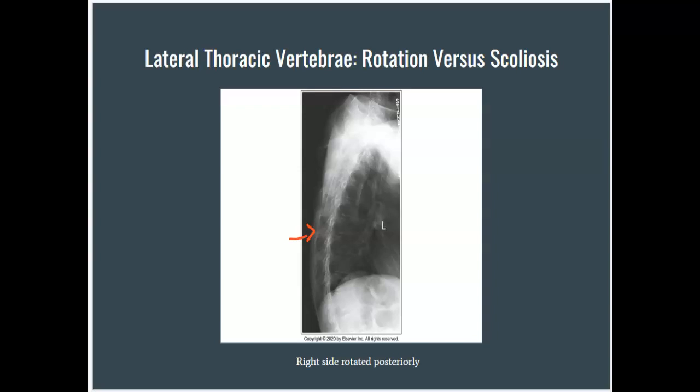If the elevated side is rotated posteriorly, the posterior ribs demonstrate more than 1 inch of space between them. If the elevated side was rotated anteriorly, the posterior ribs are superimposed on a slight rotation and demonstrate greater separation as rotation of the patient increases.